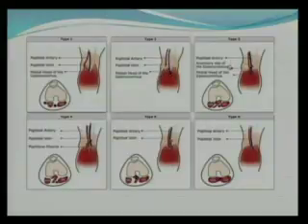upon the artery. In type 3, you have an accessory slip of the gastrocnemius muscle. This is a normal variant, and when this accessory slip occurs, it causes impingement upon the artery. As you can see over here, it's like a sling that anchors the artery down against the bone, and that is the type 3 impingement, in which the medial head and the lateral head of the gastrocnemius muscle are normal. The course of the vein and the artery is normal. However, the accessory slip of the muscle is to blame.